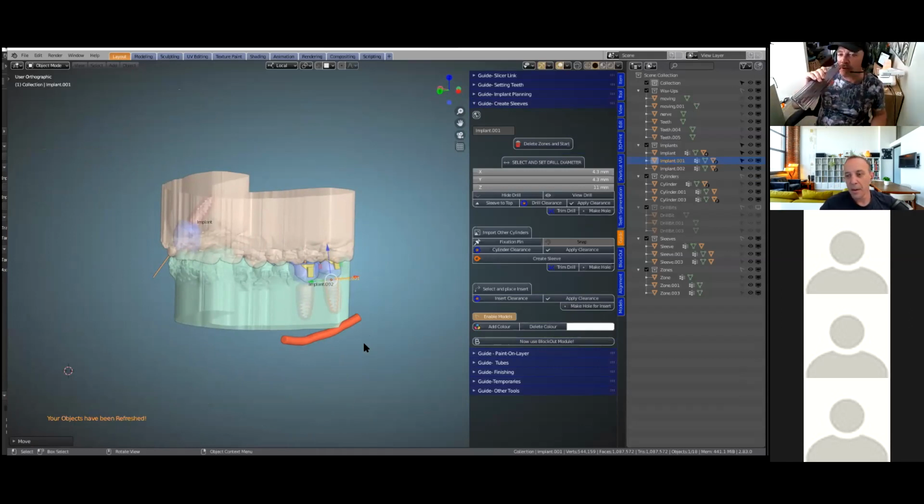Are you still there, Wolf? Yeah. So with your models, do you still work in transparent, or are you going to change those? Yeah, no, we finished with that. That's merely to view through them. Yeah.